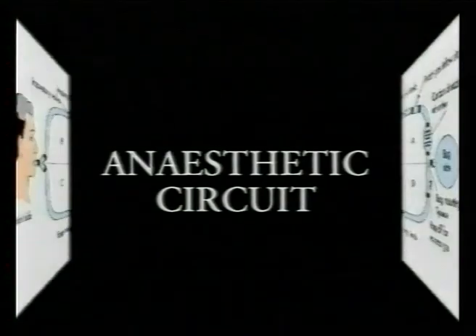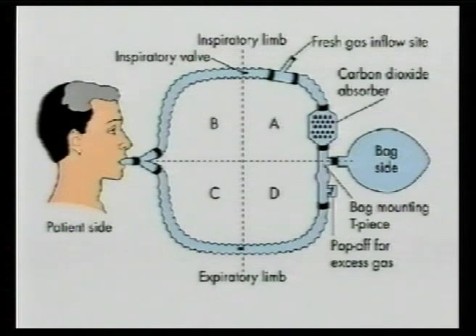The basic system for anesthesia of adults is a breathing circuit. It consists of an expiratory and inspiratory limb, which are separated by two one-way valves. The system contains also a bag, which is used as a reservoir or can be used for manual artificial ventilation, a carbon dioxide absorber, and an adjustable pressure limiting valve.